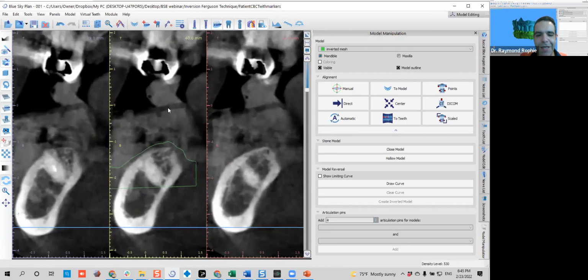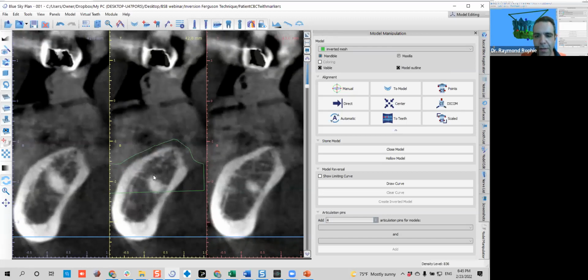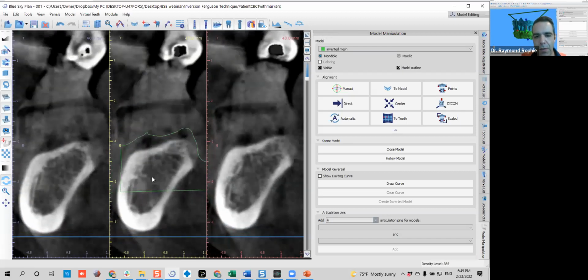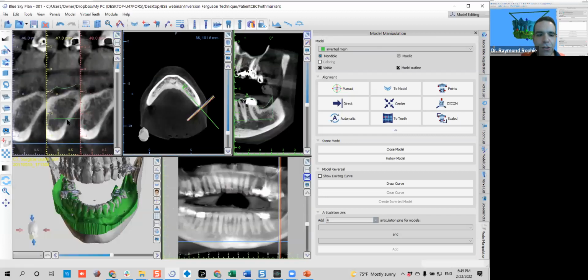Of course, it's not completely radiopaque, and for you to say that this is not possible, I would love to show you how it is. But anyway, here it's the most important area because this is the area where you're going to place your implant. Okay, so you need to see at least that the outline of your models are right, following at least these shadows, so you can verify that it's fully seated on the model. Okay, good, perfect. So you finished checking this view, you're good.